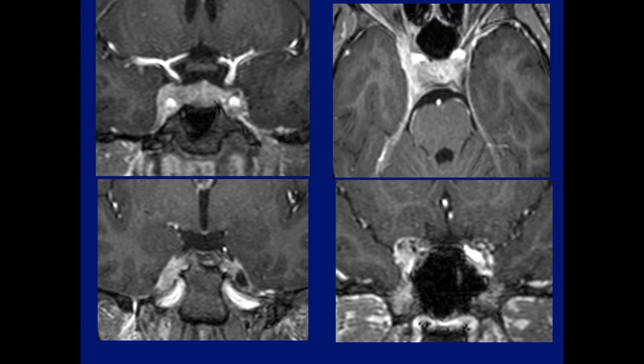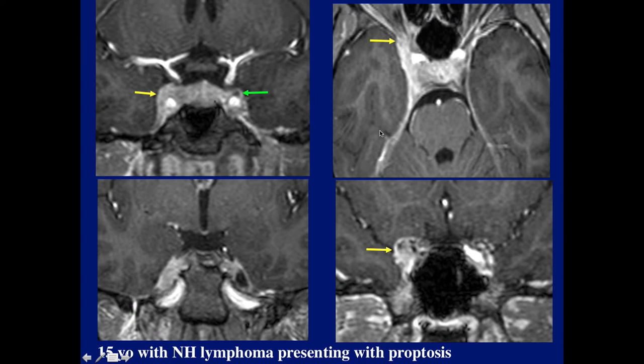Which side is abnormal here? Again, it's the right. Notice all this tissue over here, and a common condition.